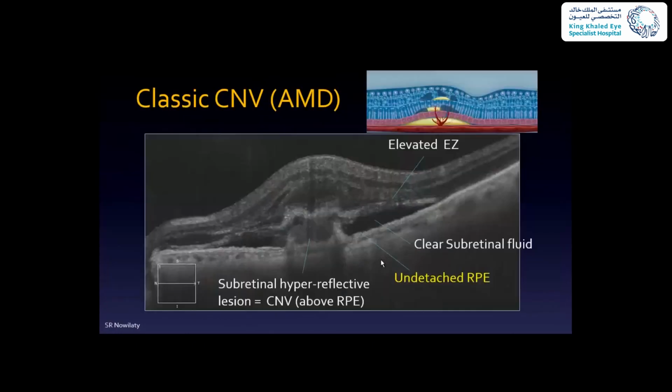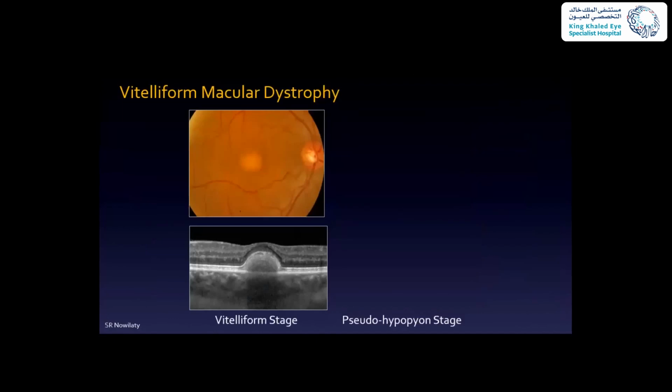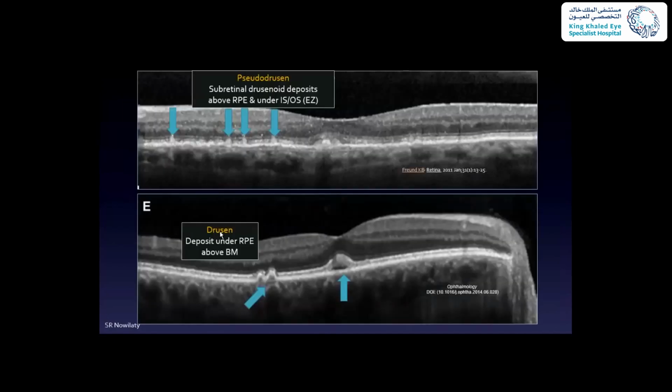What else can I show you? Yeah, hold on. I showed you drusen before. I hope I'm not missing them. Yeah, this is drusen, okay? So you've got the RPE right there, elevated. The Bruch's membrane is intact, and the choroid doesn't follow. You can see the elevation.